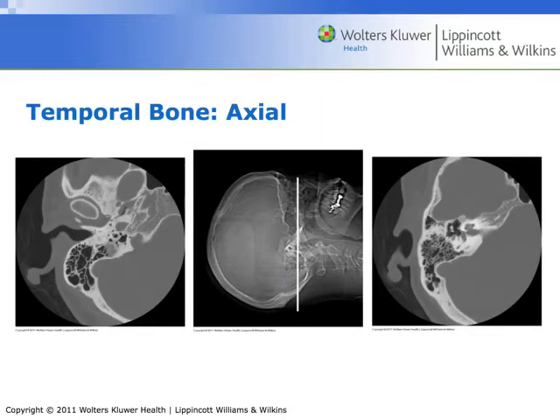Okay, now we're looking at axial images of the temporal bone. The mandibular condyle. That's the sphenoid sinus.